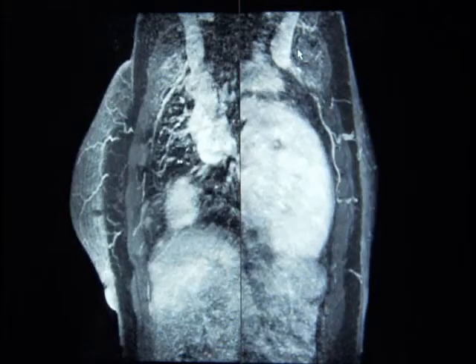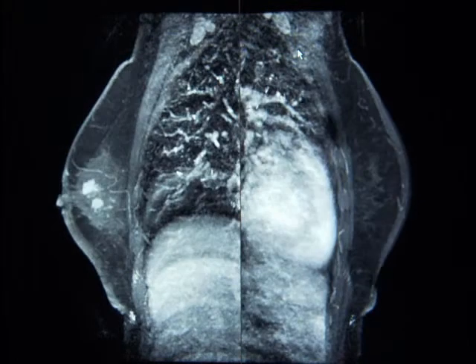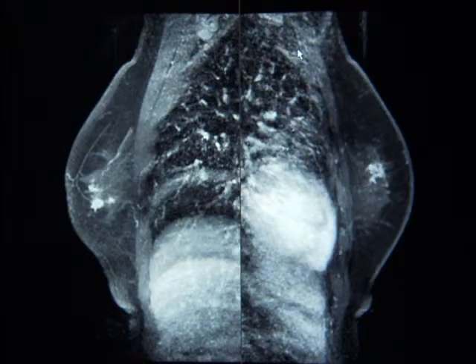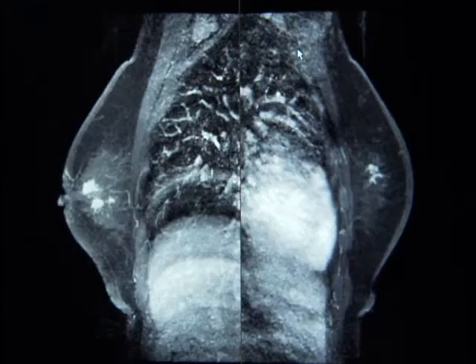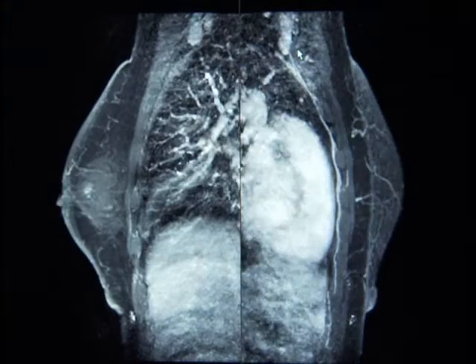This again provides a very nice overview of the breast with much greater anatomical detail than we get on the subtraction MIPs. This obviously is applicable only with a more advanced technique where you require your dynamic acquisition with fat saturated pulse sequences. As on all other sequences, color parametric mapping can be applied to these as well.